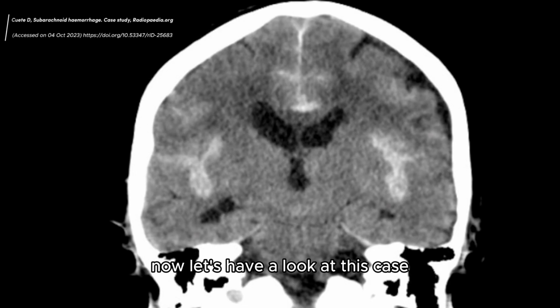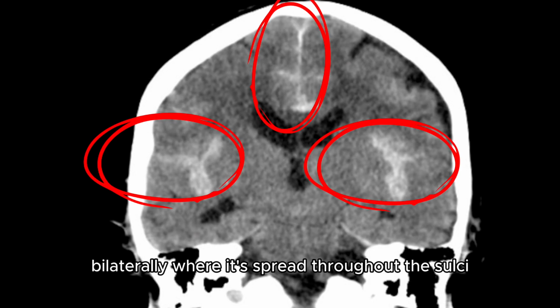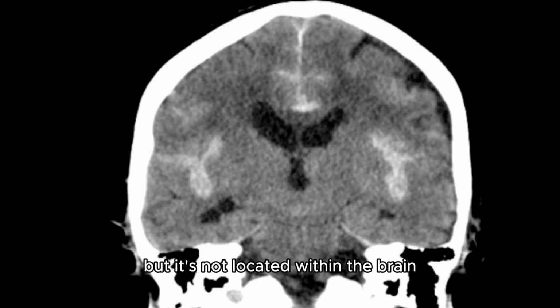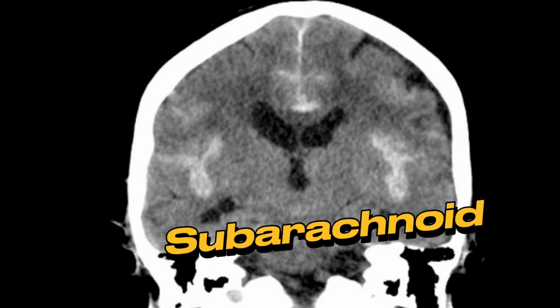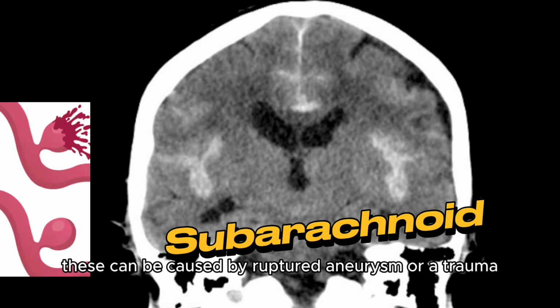Now let's have a look at this case. Here we can see quite diffuse and massive hemorrhage bilaterally where it's spread throughout the sulci, but it's not located within the brain. This is a classical appearance of a subarachnoidal hemorrhage. These can be caused by a ruptured aneurysm or a trauma.